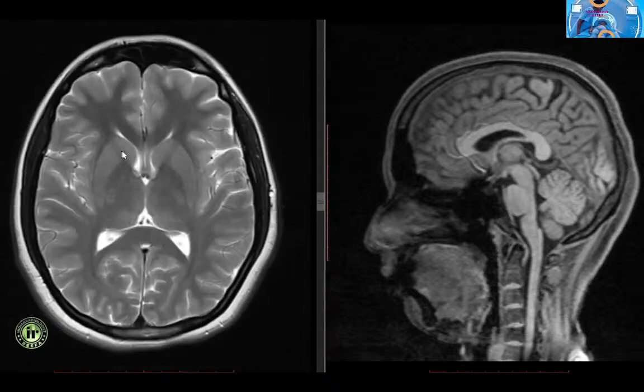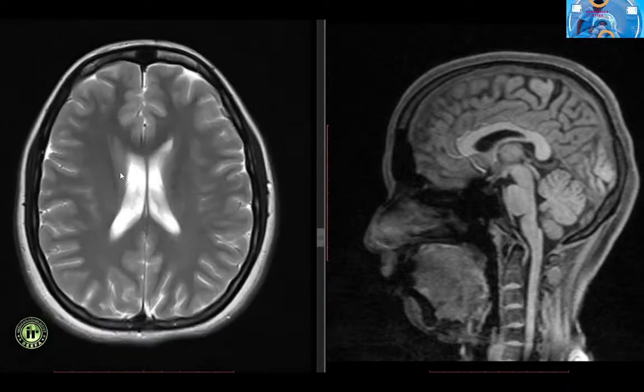The basal ganglia consists of the caudate nucleus, the lentiform nucleus, the claustrum and amygdala. The amygdala is associated with the limbic system and we shall be discussing about it in a separate lecture. The caudate nuclei are C-shaped structures lying along the lateral ventricle. The head of the caudate nucleus indents the frontal horn of the lateral ventricle with the body lying adjacent to the body of the lateral ventricle.